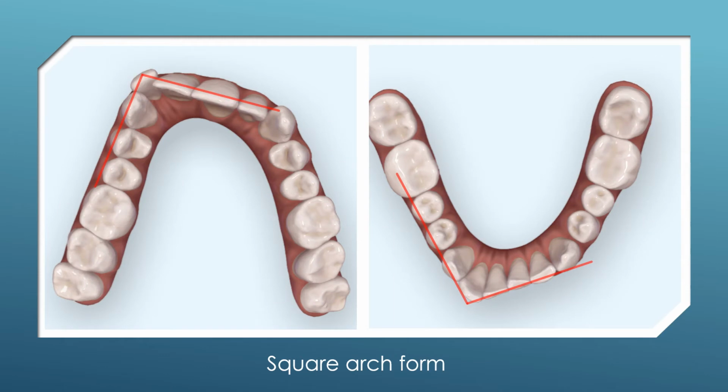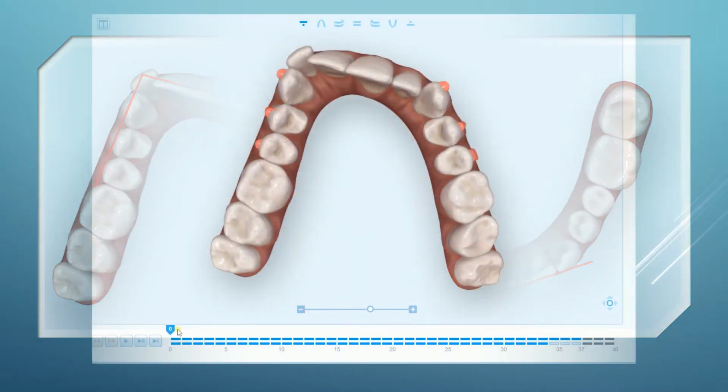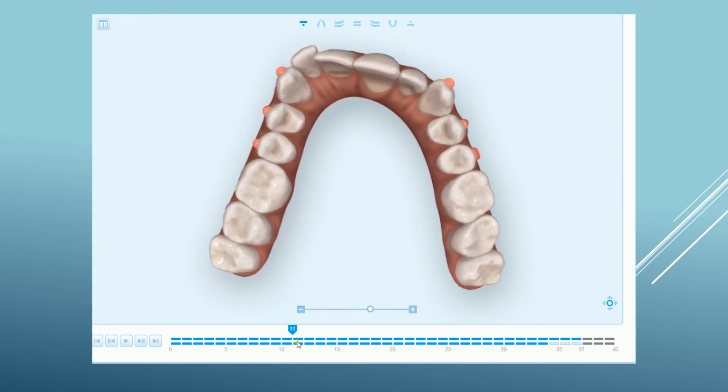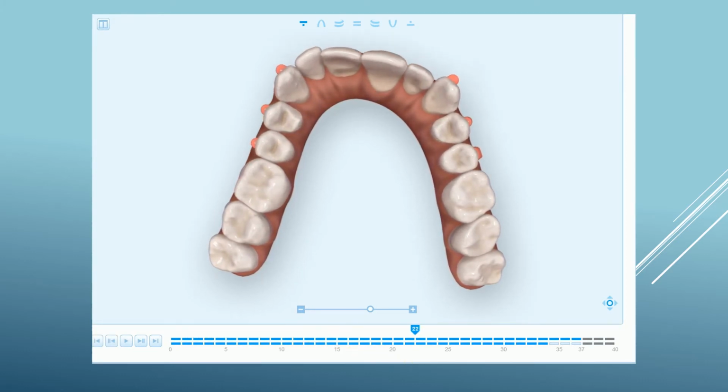Here are screenshots of stage 0 of the initial treatment plan, or ClinCheck. This is before any movements occurred. Here's an occlusal view of the ClinCheck for the same case. It shows the movement stage by stage. There were 37 regular stages. No additional aligners were needed to treat this case. You can see at stage 37 that the arches are ovoid form.